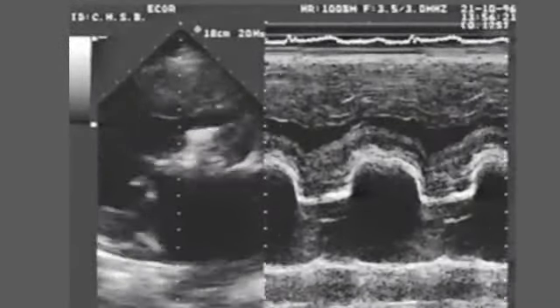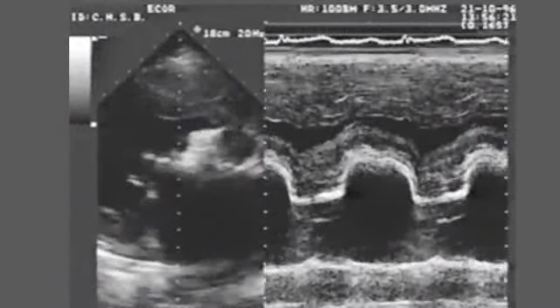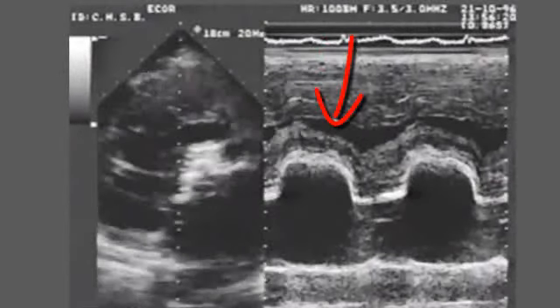What we see is this well delineated border of the echo from the base of the mitral valve and a large vegetation with its smudge appearance that we did not identify by 2D echo because we thought it was a calcification in the aortic valve and not a large vegetation, well demonstrated by M-mode. See also the torn paper sign.